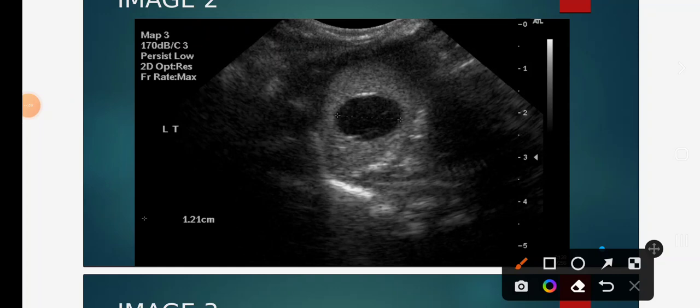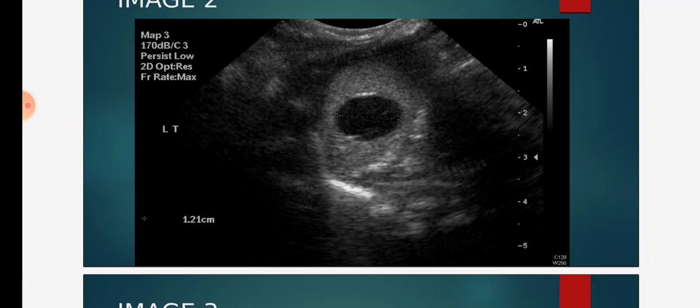I see inside of this spleen features of a hypoechoic mass, well defined, smooth wall, and anechoic inside of the spleen. The feature of a simple cyst. A simple cyst is rarely found in the spleen, caused by two things, maybe congenital or traumatic.